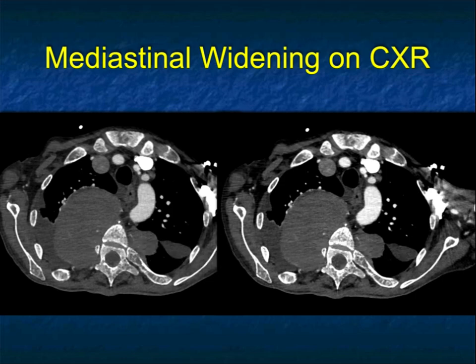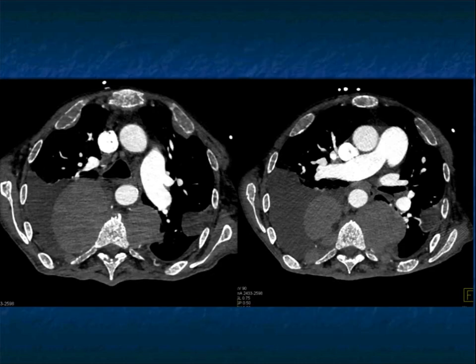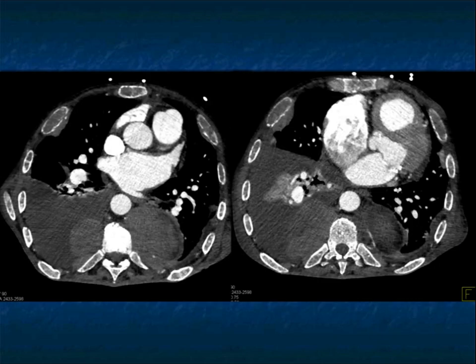And when you look at them, you start thinking, well, could this be lymphoma? What else is going on in this patient? Well, one thing you notice is the ribs are expanded. The ribs are enlarged. What exactly is going on with these ribs? And the spine, well, look at the coarse trabeculae even on these axial images. And you can see these para-aortic masses are large, asymmetric, and we're tracking them down through the length of the chest. And then you also notice with some of these ribs, there is some soft tissue element.